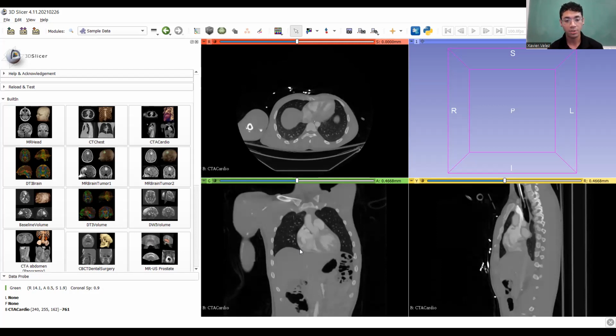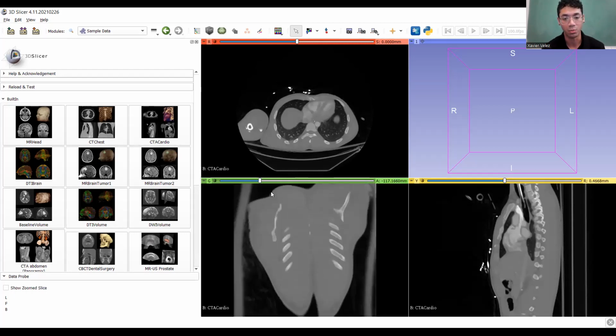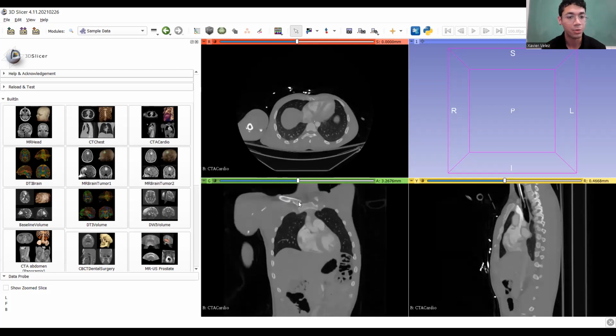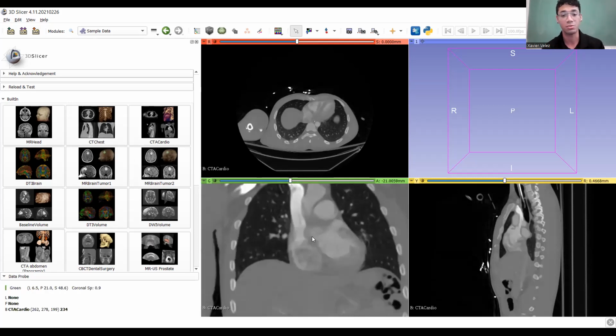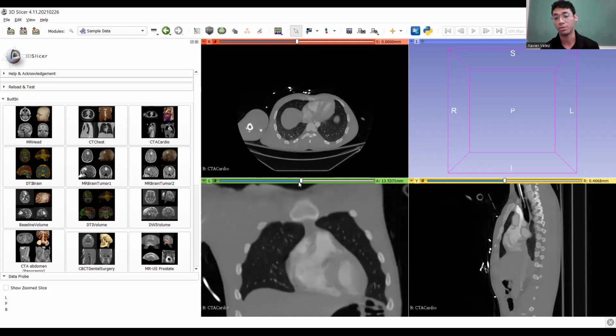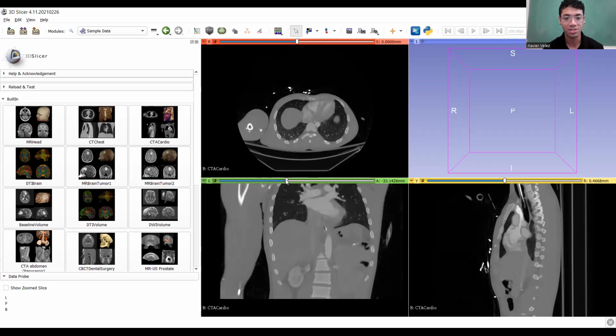So first things first, where the heck even is the liver, right? It's a super weird body part, it's probably around the stomach area, but how do we actually know what in all of this mess is the liver and what's the rest? You guys can probably tell by the fact that this is named CTA cardio that this file is primarily used for heart segmentations. This was actually the same file that I used in one of my previous workshops where we segmented the heart. But it's a little tough to see what we're going to want from this.